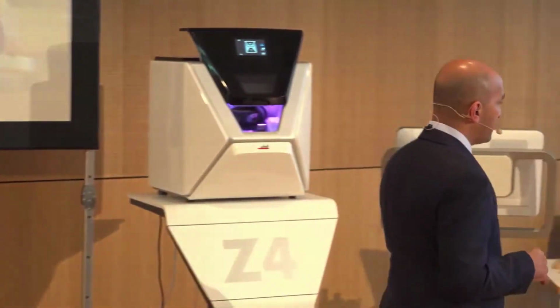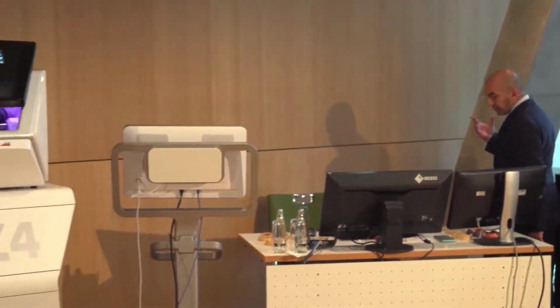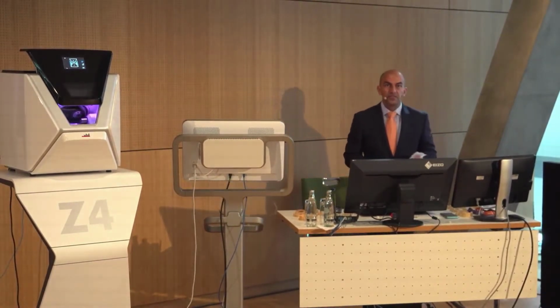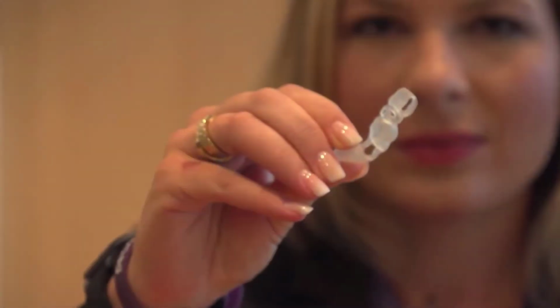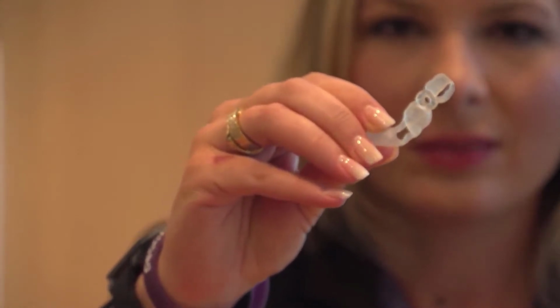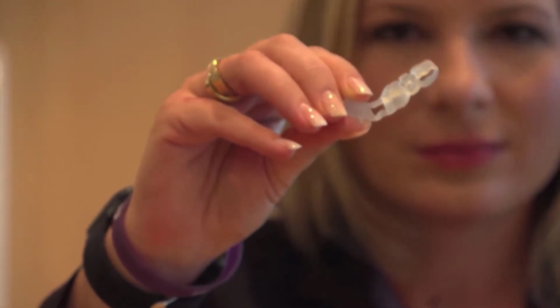What I'm going to show you before we close is some guides that we've created already, because once you've created a guide, and as Udo says that you need to do your finishing and you need to go ahead and do your curing, then you need to place the sleeve. So the sleeves come from different manufacturers, can either be from the implant company themselves or they could be from third-party companies. If you want to take that to the camera, this is a finished guide for this exact case that we printed this morning. So that's how, just waiting for that to come into focus.